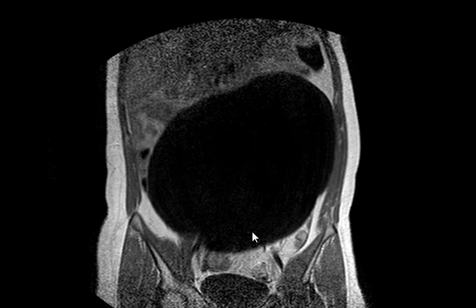It's intra-abdominal, from the bowel, maybe a mesenteric cyst. You said pelvic a moment ago. Pelvis, where? It's not from the uterus. You tell me, I don't know. Go down. Here, yes.